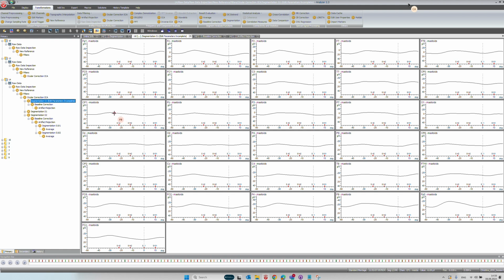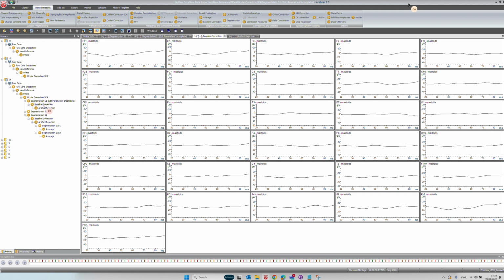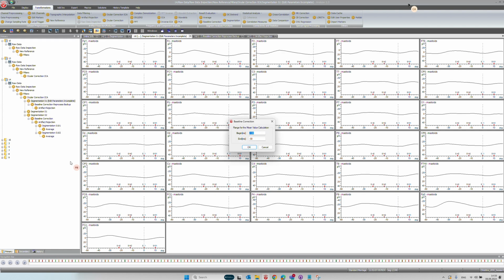Our baseline needs to have an adjustment of minus 20 in principle, because this is marked as our 0 now, so we are working relative to this. Therefore, we need to rework this one. Minus 120 to minus 20, because that will give us the actual minus 100 to 0, right? Because of the relative time point that we have here. So we rerun that.